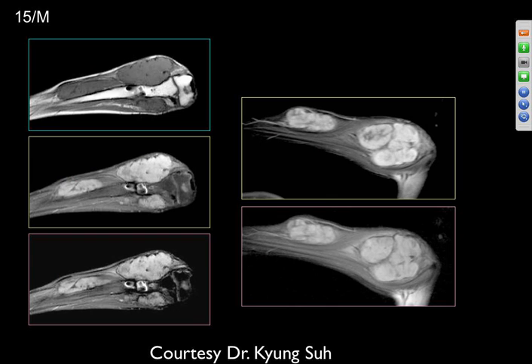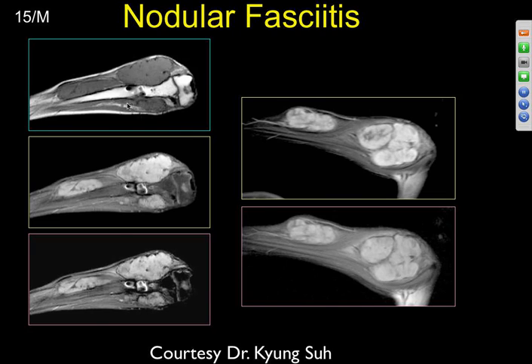The previous image you showed, some of the erosions on the bone, can sarcomas do that, or would that favor a benign process? It would favor more of a benign process. That's a very good observation. Sarcomas usually are rapidly growing. Instead of getting remodeling like that, you get more of a destructive, invasive pattern. Looks like there's been some surgery here with some little metal artifact there too.